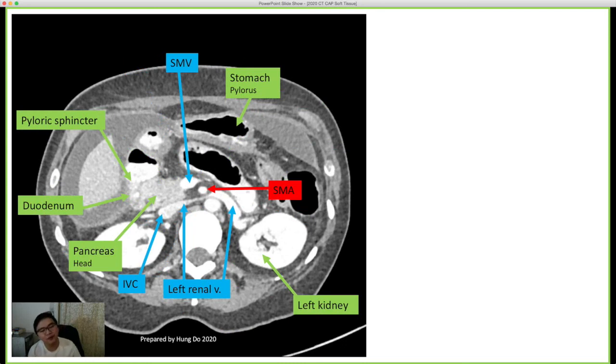So as we move further down, again, you just see those structures we mentioned, and you can clearly see the left renal vein crossing the midline and eventually confluencing with the IVC. You see ascites throughout this patient. This patient has ascites, so there could be many reasons why. Without the history, it's very hard to identify it, but it could be drug-related, cardiac-related, cancer-related, many different things.